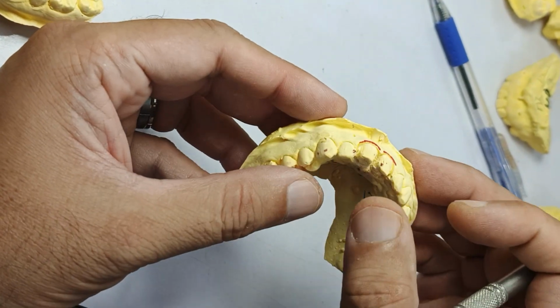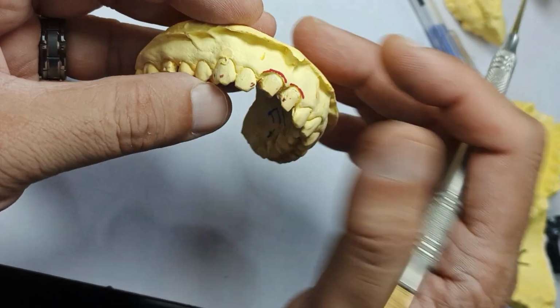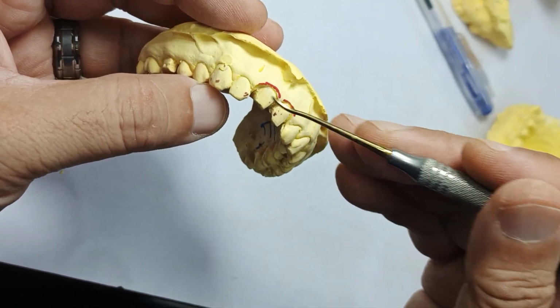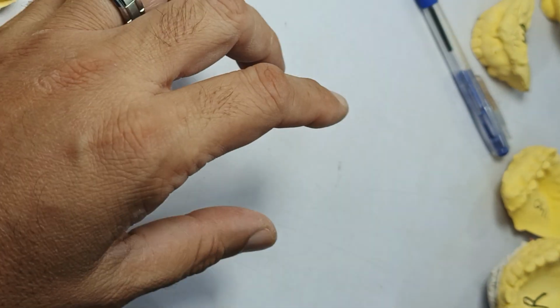And look at this. Looking at the rest of the mouth, these teeth did not need crowns, very likely. But just somebody cut them, and the gingival margin doesn't even match from right to left. These are just chopped up teeth. Let's look at some more.